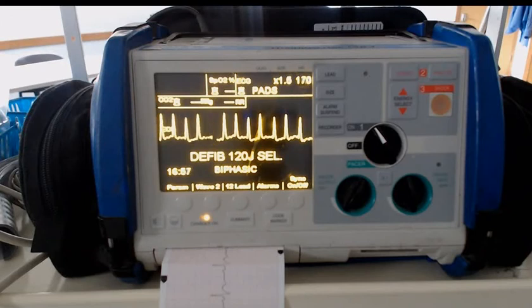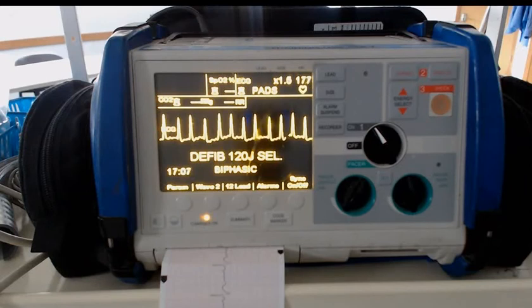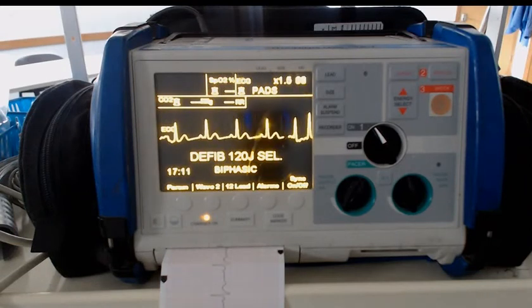You might see a controlled AFib at a rate under or right around 100, and there are people that go through life with AFib with no serious complications as a result. Back to our normal sinus rhythm.